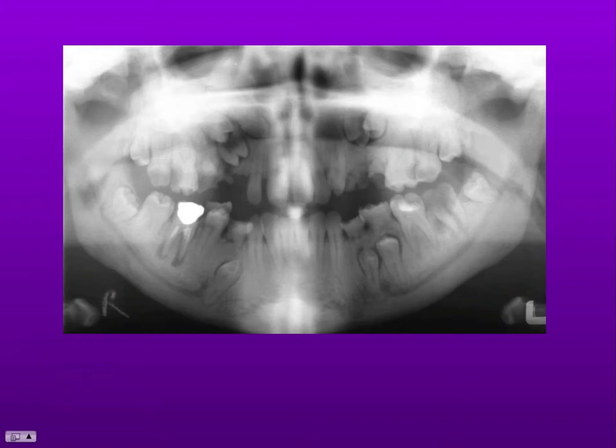Now, in the previous seminar, we talked about sclerosing osteitis due to inflammation and infection, and we have got a little bit of that around this tooth here. Beyond the radiolucencies, the granulomas or chronic abscesses on these roots, we can see a slightly whiter bone, more radiopaque, and this is sclerosing osteitis. But beyond this, all the bone is radiopaque, and we can really see the inferior dental canal standing out because of the dense bone, which is almost uniformly cortical.